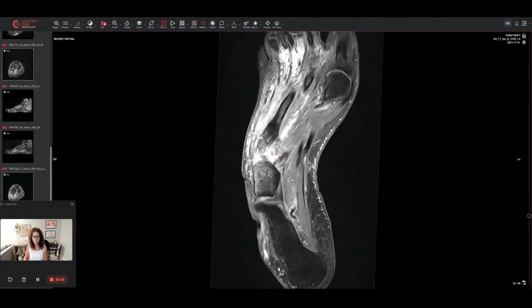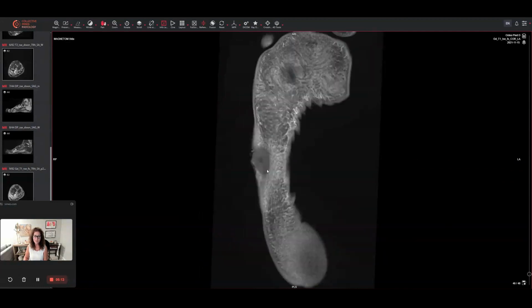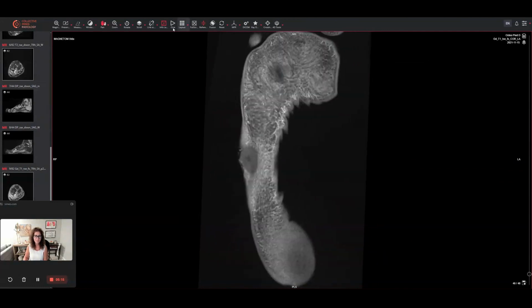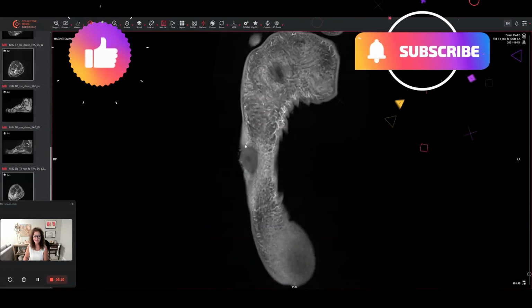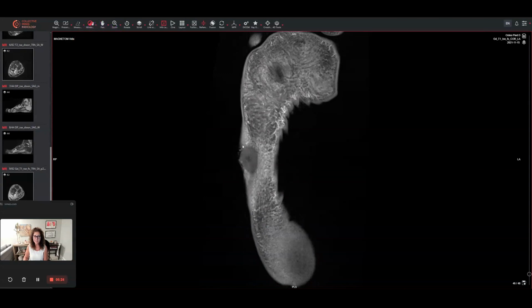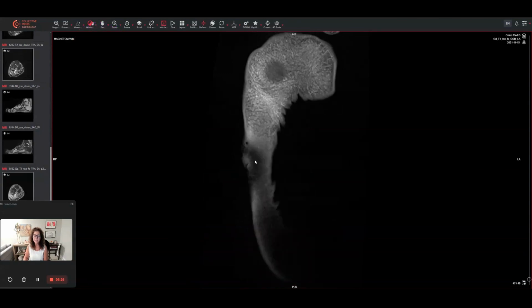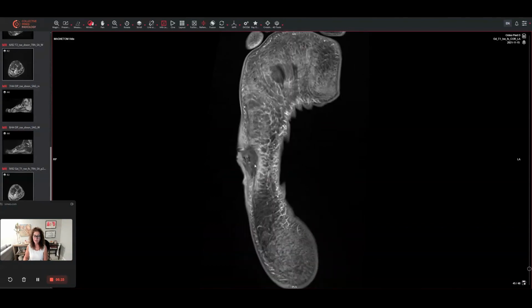And then on the post-contrast exam, we can appreciate as we go towards the ulcer base, there's an area of non-enhancement seen here. And we can window that a little bit better to bring out the different contrast of the skin that's surrounding this area that is enhancing, that's cellulitis, surrounding an ischemic region of ulceration. So there can be an area of pus.